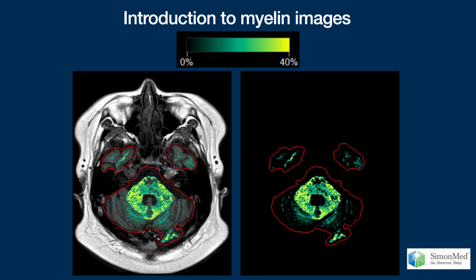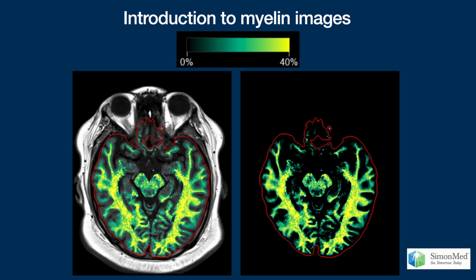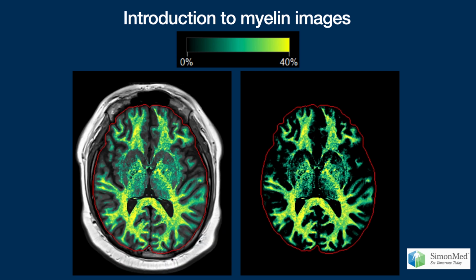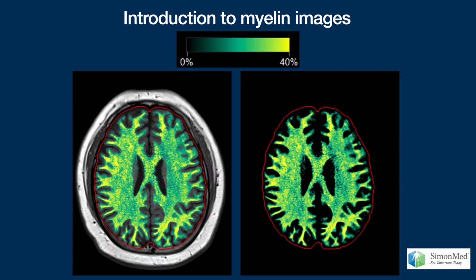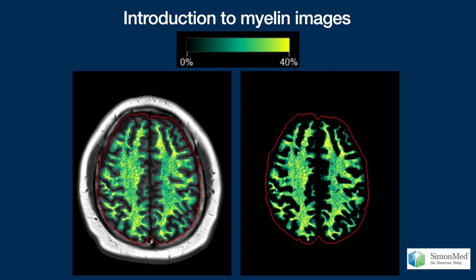As we scroll up, note the shades of green-yellow in the Pons. Thalami. And Centrum Semiovale. When we look at white matter lesions on T2 and FLAIR, the question we will be asking in every case is how much myelin is present within each of them.